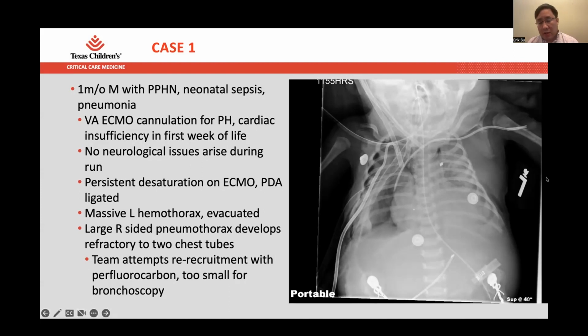So there's a pigtail along the side here that doesn't really drain anything. There is a thoracostomy tube here along the side. Oh, I'm sorry, can you all see my pointer as well? Yes. Oh, okay, good. It also doesn't drain anything.